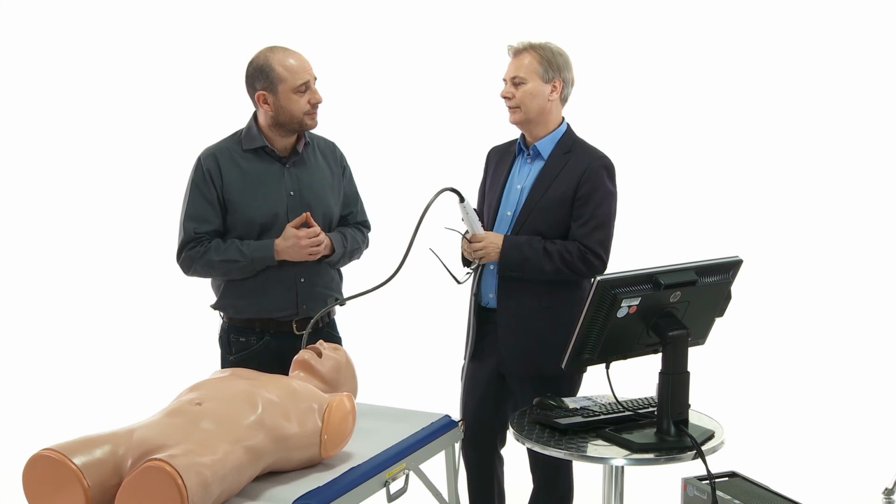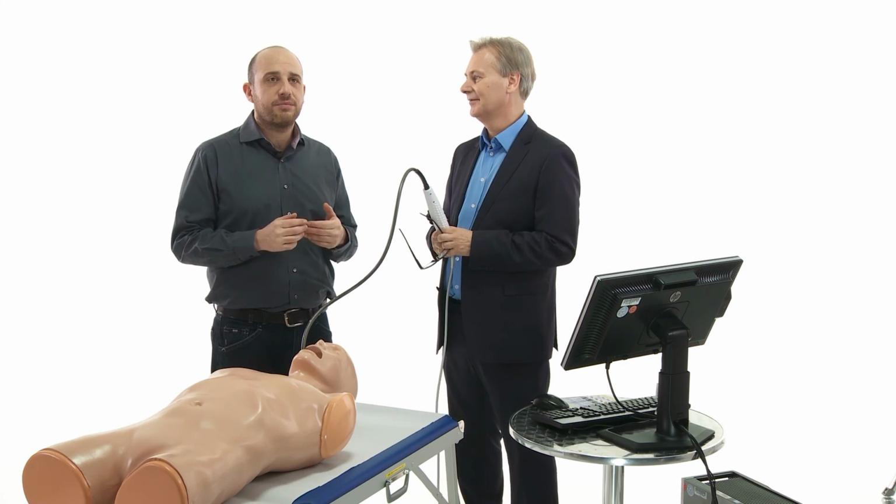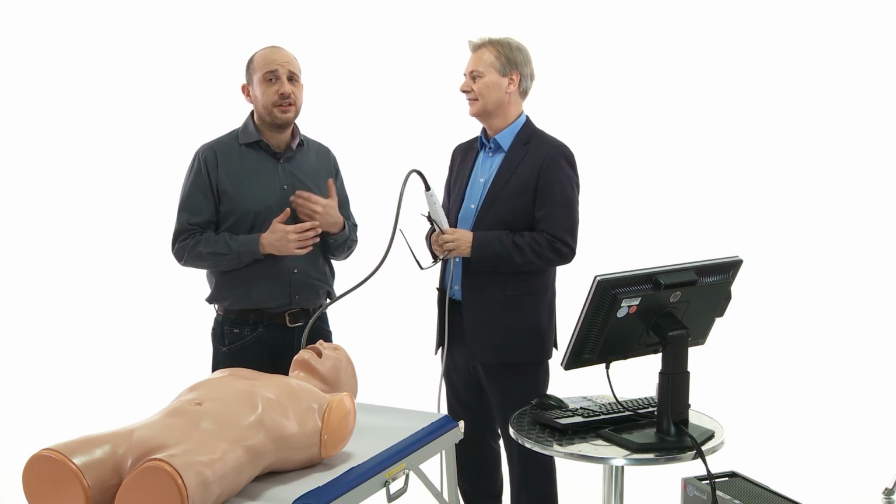Let me ask another question. When I come to the OR, for example, or maybe to the intensive care unit, patients have the probe inside for extended periods of time, hours even, days. Is that something that you're concerned of? Naturally, there could be some problems when the indwelling time is very long. Personally, I made a pilot study with the colleagues of cardiac surgery, and we performed gastroscopies after the introduction of the probe and after the removal of the probe.